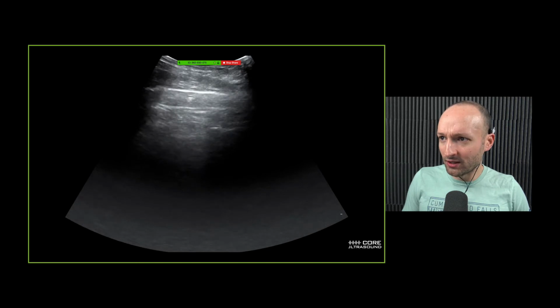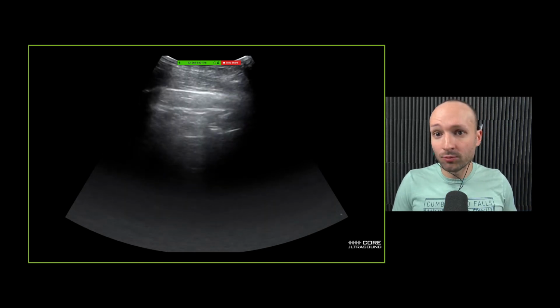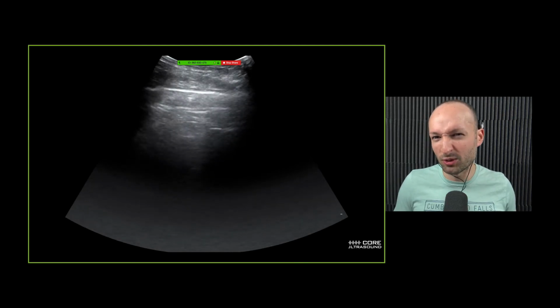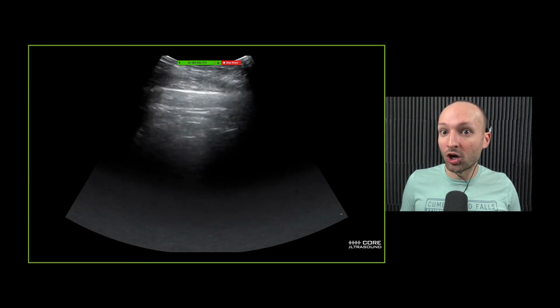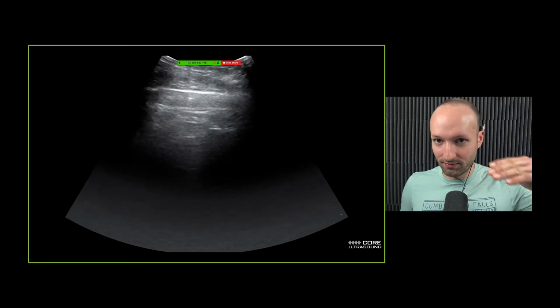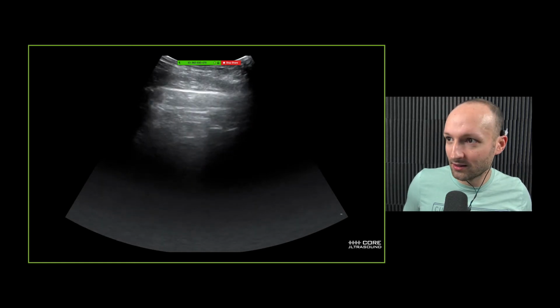So this was a patient that I saw that had COPD, and had some wheezing on his examination, but had a little bit more of a cough than normal, a little more productive, and had a low-grade fever. So we're talking like 100.9-ish. This was what I saw in most of this patient's lung. So you guys just mentally think about what this looks like. If you just saw this everywhere, what would you think?